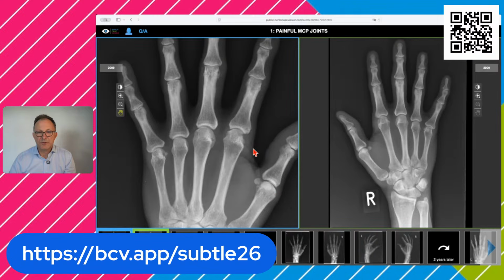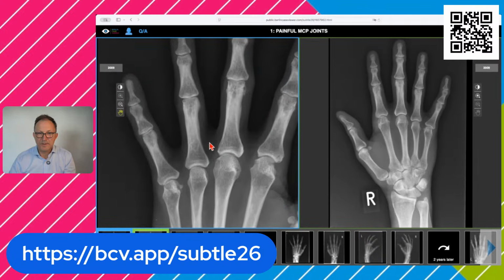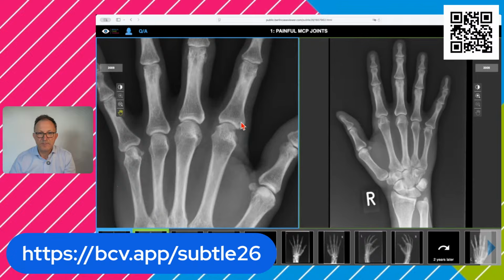Second MCP joint, I don't know if you have seen it or if you commented on it, doesn't look so nice, because if you look closely, you see there is some cystic area here, and also the cortex that we would expect here is broken here. You see that the cortex should look like this, should go smoothly here, and this is not the case here. And also this round shape is not here, so it's irregular, and there are maybe some cystic areas.